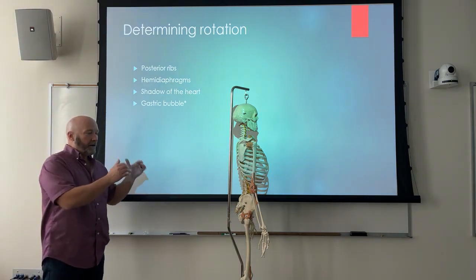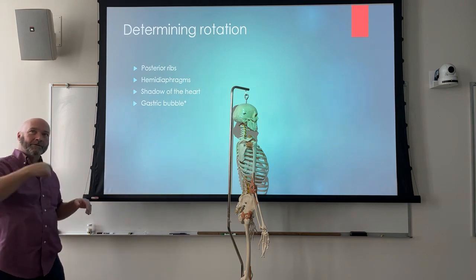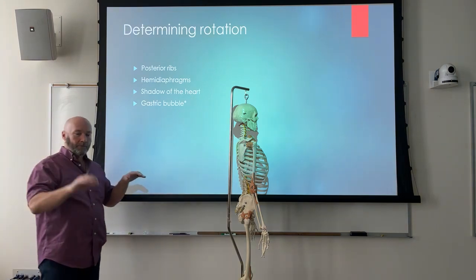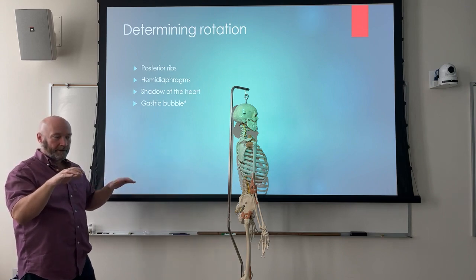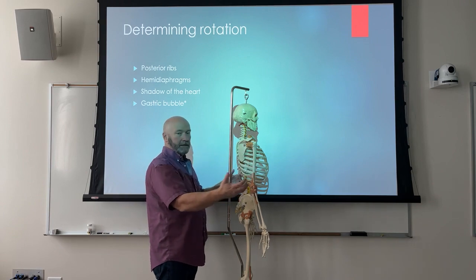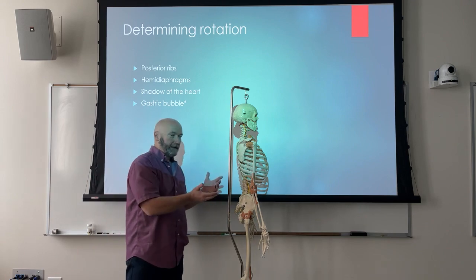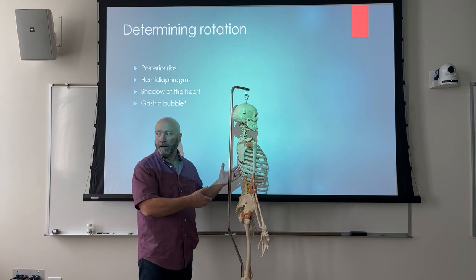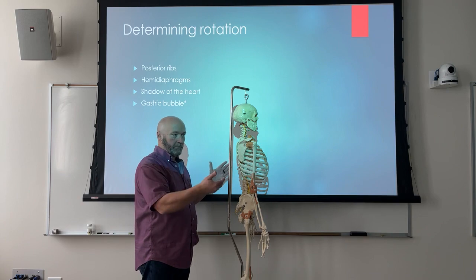Now, they should, on the image, appear to be superimposed. And I can't really demonstrate that with my hands because of the way the projector's coming down from the ceiling. But the right lung should be higher than the left, right? Normal anatomy. But because of the divergence of the central ray coming in and because the right lung is going to be further away from the image receptor, remembering that with any kind of angulation, what's furthest from the image receptor is going to move more, right?